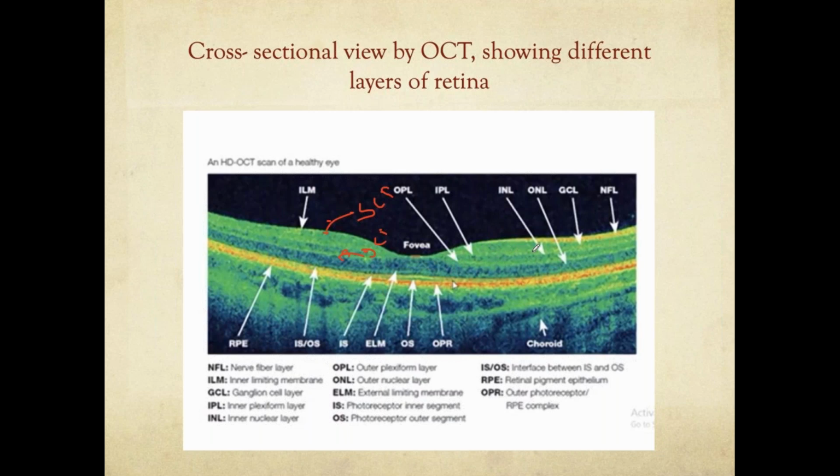Now, why is this important? In certain retinal pathologies, when there is a complete splitting of two hyperreflective layers, when there is more splitting between any two hyperreflective layers, the prognosis is usually poor. It's not just for here, for any layer. If there is Bruch's membrane and the RPE, and there is a space in between the Bruch's and the RPE, two hyperreflective layers, the prognosis is usually bad.